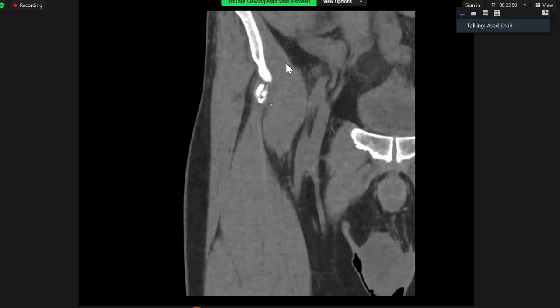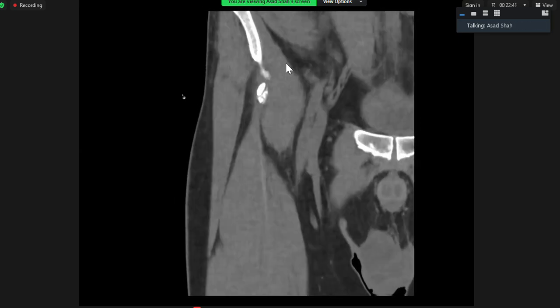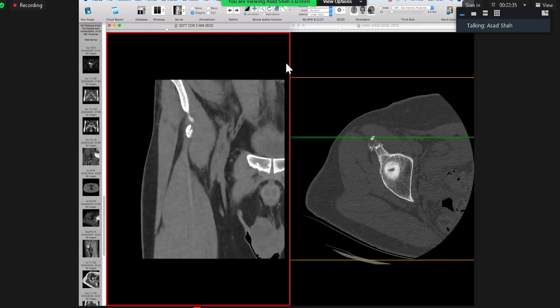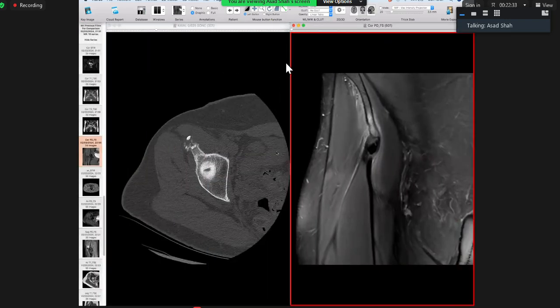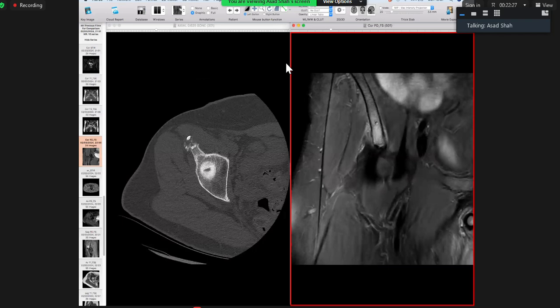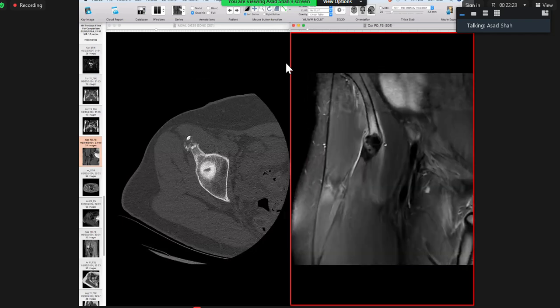If I show a shoulder X-ray with this calcification, and the patient is in severe pain, what would you say? Calcific tendinosis. Calcific tendinitis, yeah. So this is calcific tendinitis of rectus femoris. These calcifications usually go outward, but they can go into the bone as well, causing this kind of reactive intraosseous extent with a lot of osteitis. This is all a chemical, sterile kind of process.